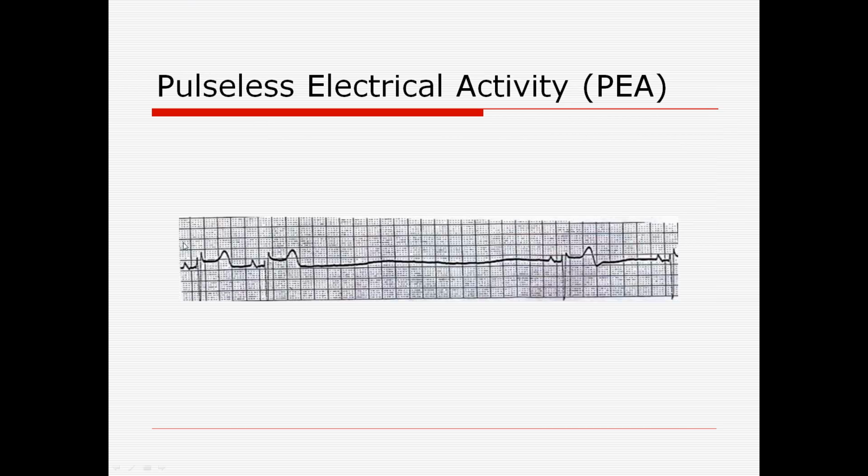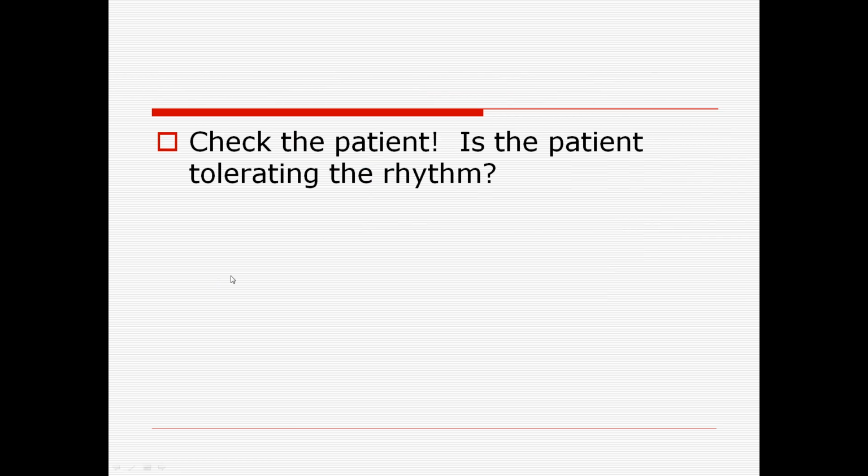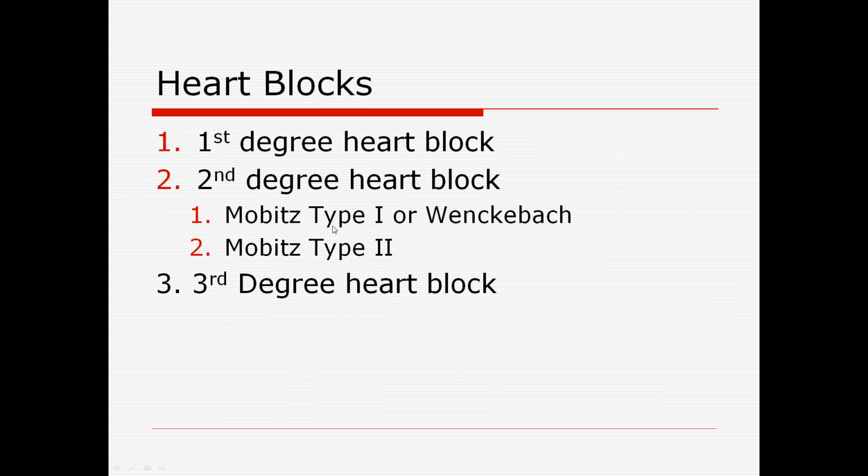Oh, this great big pause right here. Okay, we always check the patient first. Is the patient tolerating the rhythm? Check the patient, then treat the symptoms. So check the patient, check the leads.